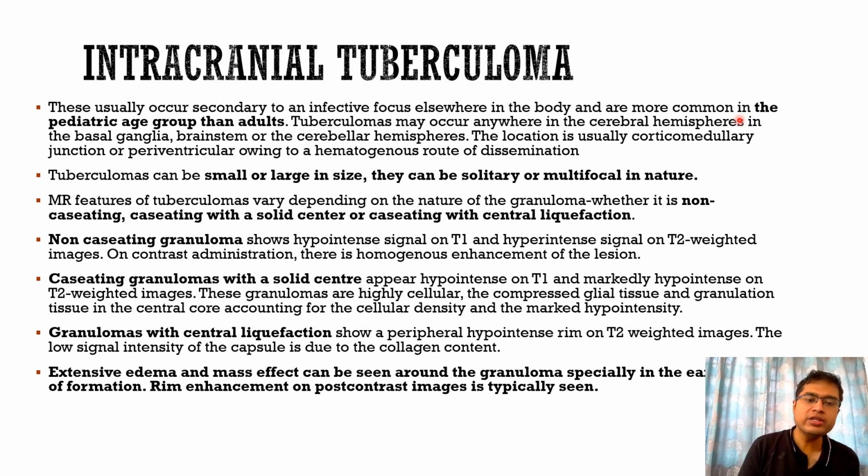And this low signal is because of the capsule which has collagen content. There can be extensive edema and mass effect seen around the granuloma, especially in the early stages of its formation, and the rim enhancement on post-contrast images is typically seen. So this is what is very important.